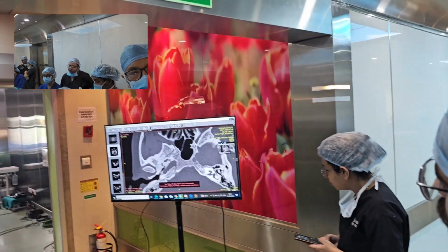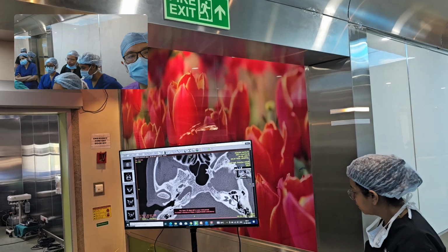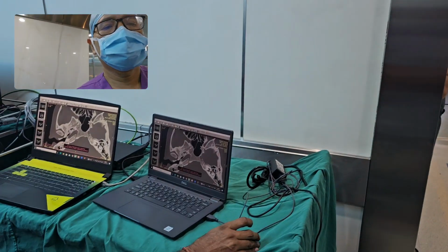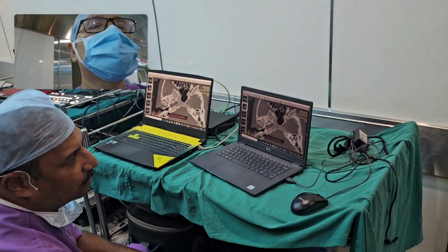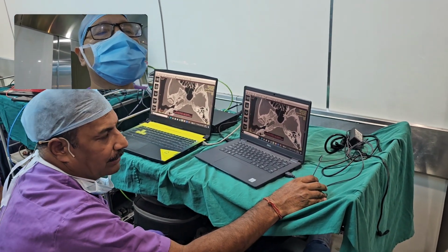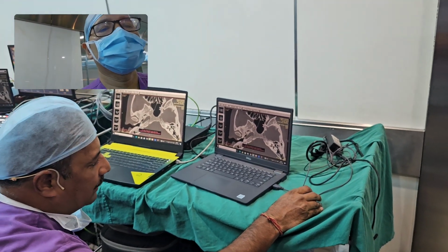That's the facial nerve horizontal course. Look at the entire horizontal course, which looks intact, covered by the bone. It is nowhere looking dilated or dehiscent. See, an overhanging facial nerve has to be dehiscent. It cannot overhang with the bony canal intact. It has to be dehiscent to become overhanging. So here, an intact canal rules out the possibility of being dehiscent.